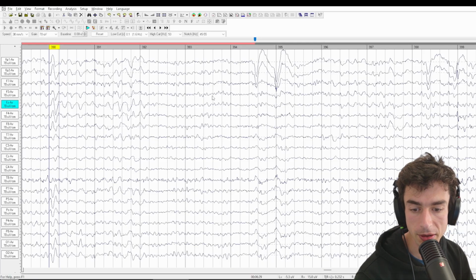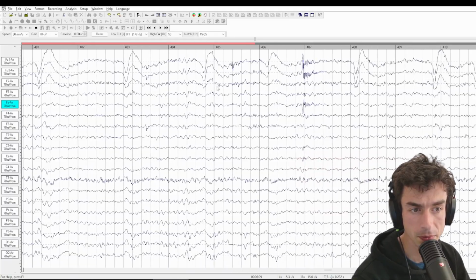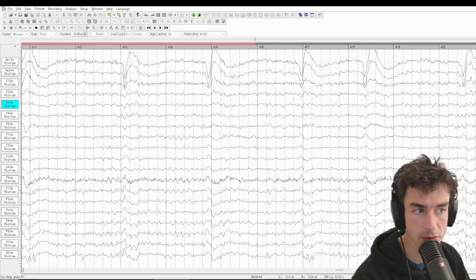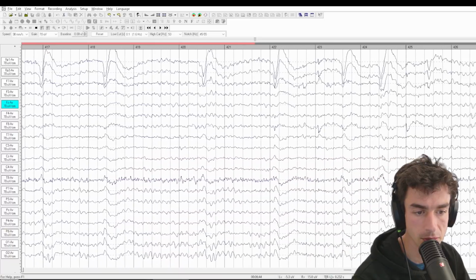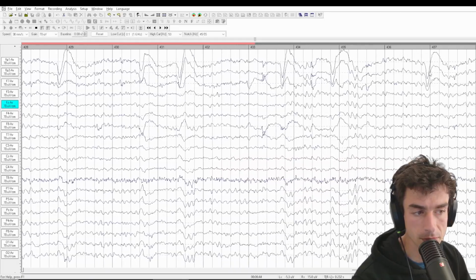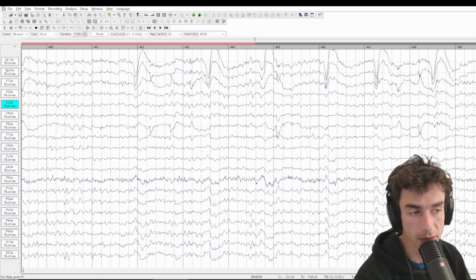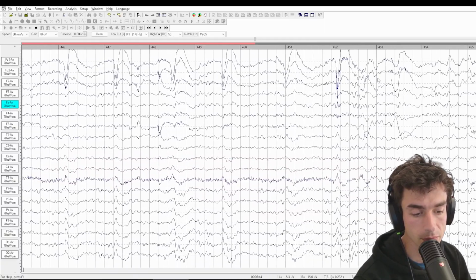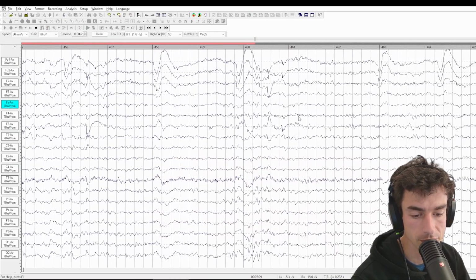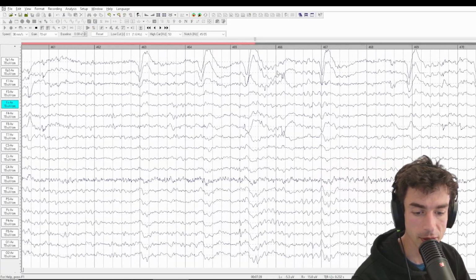Followed by a run of theta and then a dropout. So that looks like some kind of an instability. Muscle twitch. Lots of eye blink. This can be associated with trying to stay awake. Frontal theta. Again, the little bursts of alpha with the eye closures.